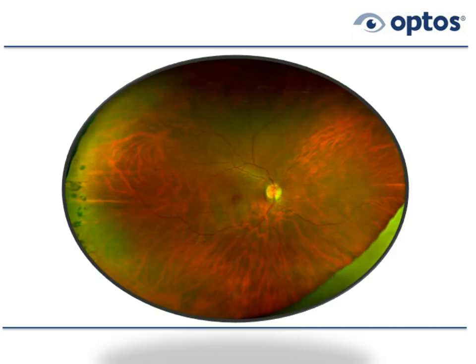Okay, the next case, atypical retinitis pigmentosa. I'm giving you the diagnosis, but it's not at all obvious what's going on when you first see the patient. The patient is a 45-year-old female complaining about some difficulty driving at night, and her fundus looks like this. She's also about a 4.5, 5 diopter myope.